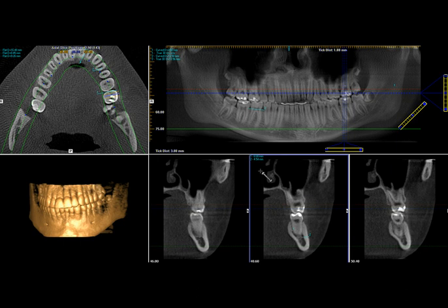4.54. And as we talked about, the distortion in CT scan is from 0 to 1.5. So it's extremely reliable and predictable, and you can find anything you want. You can even look at the cusp relationship, for the occlusion part and how to angle your implants. You can even magnify it.